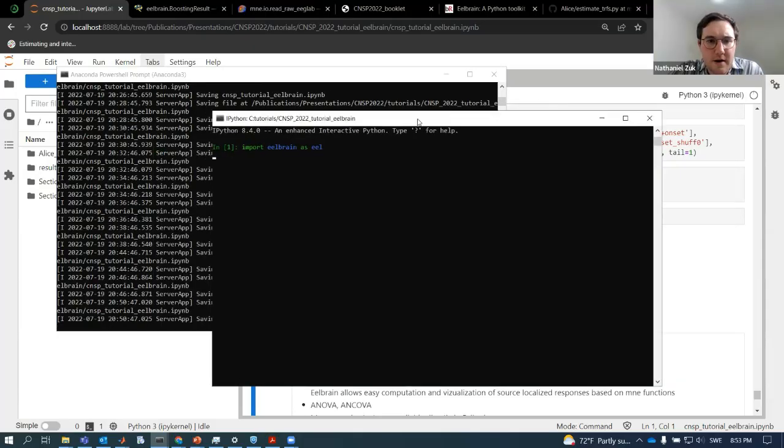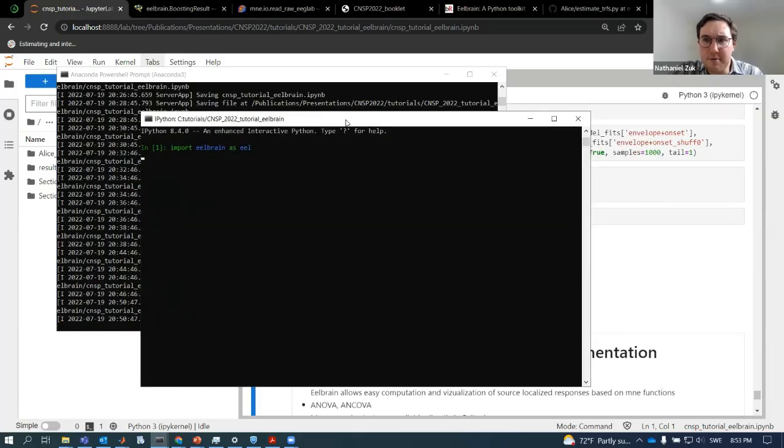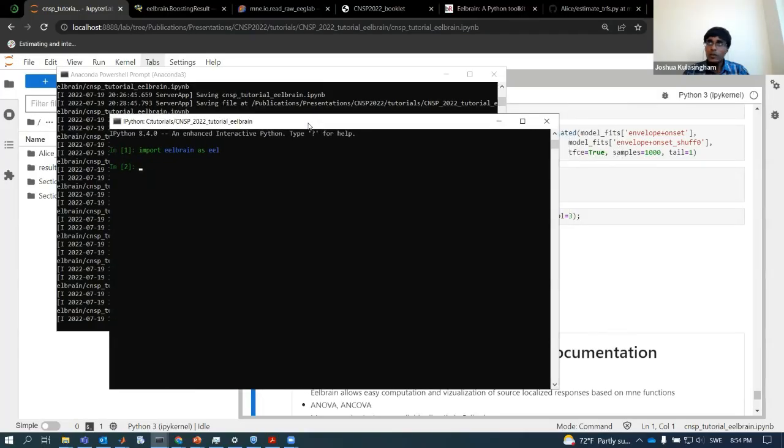So are you working in an interactive Python shell, or is this a normal shell? No, I just use Jupyter. Interactivity is nice, but I prefer Jupyter's cell blocks. I suppose interactive plots are only for something specific, like if I really want to look into how the TRF is moving, or sometimes for ICA rejection. The Eelbrain interactive tool for ICA rejection is really nice, so for those I may use interactive things. But I found that interactive plots work well on Mac, but on Windows, sometimes there are some issues.